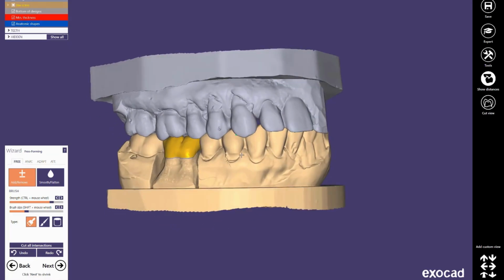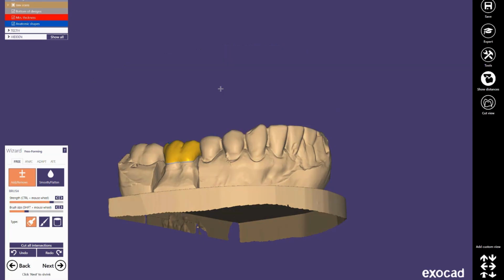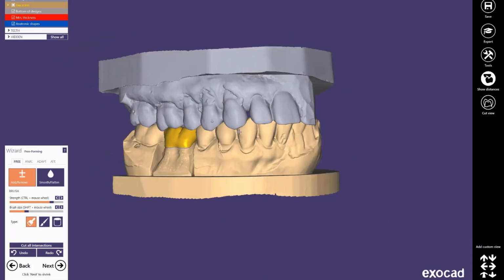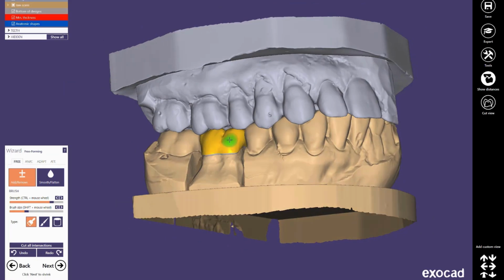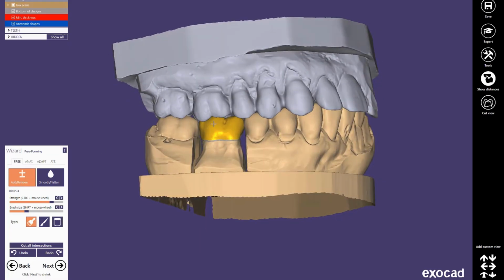I'm going to give you another example. Let's say I want to take off upper, lower and crown. So control wheel on upper, control wheel on lower, control wheel on the crown. As you can see, I took off three of them. Now if I want to bring them back, I click control shift and the wheel, 1, 2, 3, and they come back in sequence. So it's a pretty cool hotkey. It makes your life much easier when you start to work on really big cases.